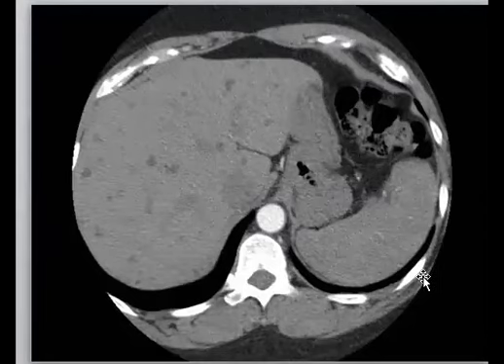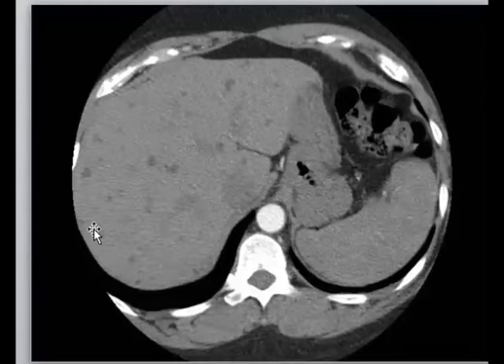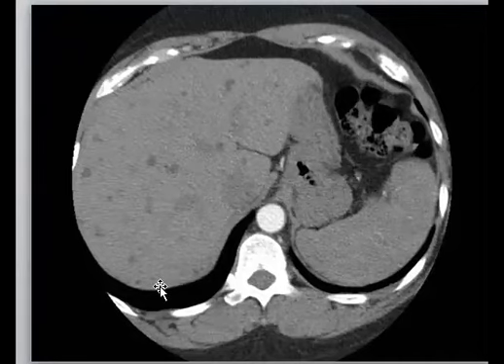Okay, so what about multiple... You can see something. Yes. These things. Multiple non-enhancing hepatic focal lesions. What is your differential diagnosis? Okay. Microabscesses, TB, sarcoidosis, metastasis. Yeah, don't forget metastasis. Nice. Metastasis, you can put it in every differential, and lymphoma, and also sarcoidosis, to be honest.